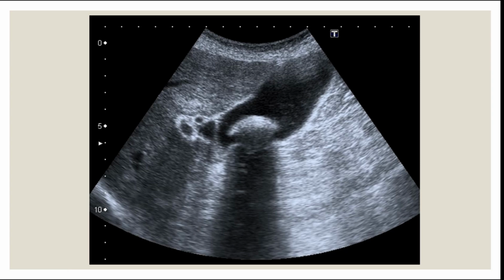Okay, yeah, go ahead. It looks like an ultrasound in the B mode, and I think that's the gallbladder that's being visualized. So there seems to be a hyperechoic area with a posterior acoustic shadow, so it might be a gallstone. Exactly. This is how you should describe it also during the final. Amazing job. And then another picture.